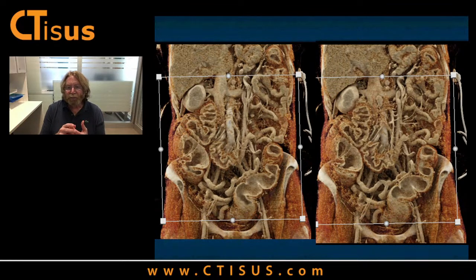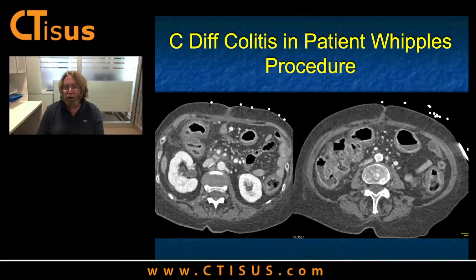But also pseudomembranous colitis. Pseudomembranous colitis is one of the things that can give you a pancolitis with a really thickened colon. It gives you almost the most thickened colon, average wall thickness 11 millimeters, and ascites is common. And this was a great case of C. diff colitis in a patient who had a prior Whipple's procedure. Now, you can have a lot of reasons for C. diff colitis.